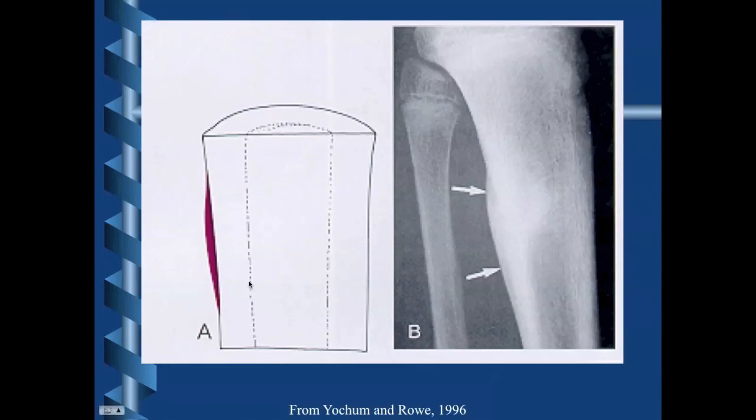This would be an example of a periosteal reaction that you would refer to as a solid response. So the red is indicating the periosteum, which is the lining surrounding the bone. There's been some sort of irritation under here, and we don't know exactly what it is. It might be a stress fracture. And basically the periosteum just gets lifted up. So essentially there's either inflammation or blood, for example, forming under there, and the periosteum, represented by the red, just basically lifts up off the bone in a solid periosteal response.